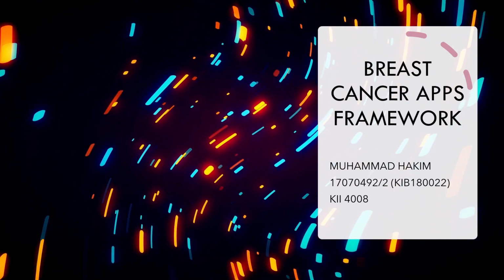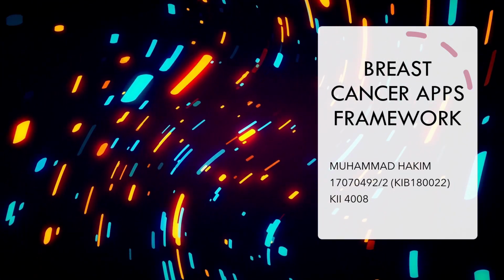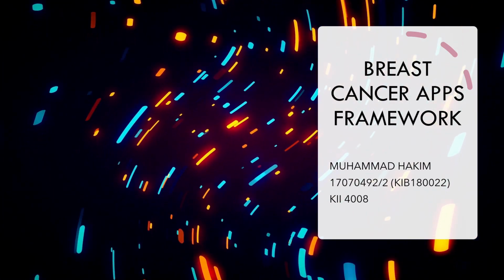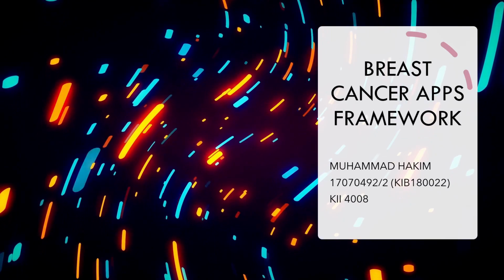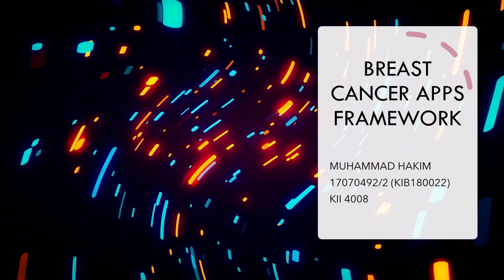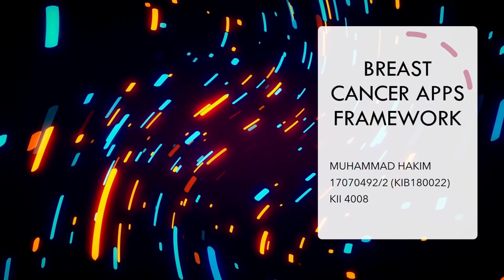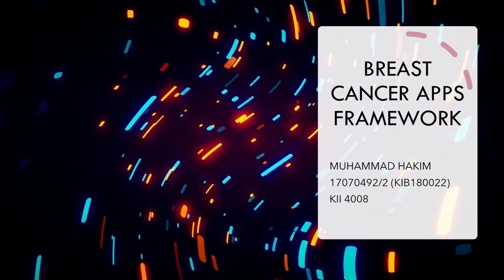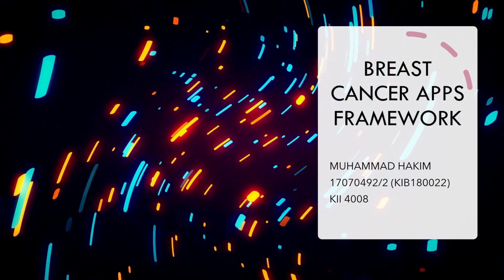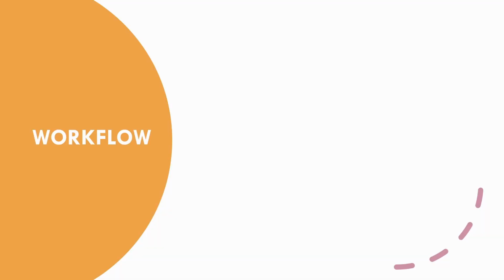In this short video, I will be explaining the breast cancer app framework that I made using App Designer in MATLAB. But first, why breast cancer? For your information, breast cancer is one of the most commonly reported cancer cases in Malaysia, which is our main concern. In this study, I got 3 mammogram images of the breast. So I would like to analyze and create an app that allows us to detect whether the patient has breast cancer or not. Without further ado, we'll see the workflow, or the flowchart, of our app.